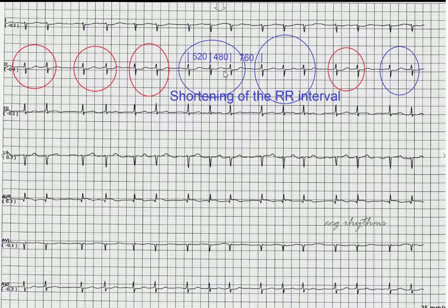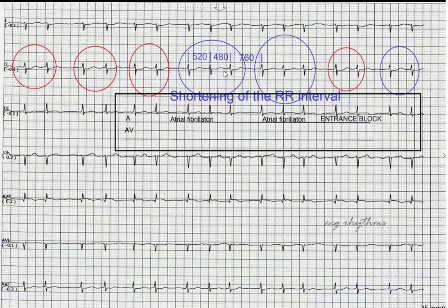If you're familiar with the works of Dr. Marriott, group beating is a footprint of a Wenckebach. Atrial fib cannot do this precise grouping. So in this case, atrial fib, as shown in our ladder diagram, there is an entrance block. Entrance block denotes failure of an impulse to reach, enter, suppress, reset, or discharge a dominant pacemaker.